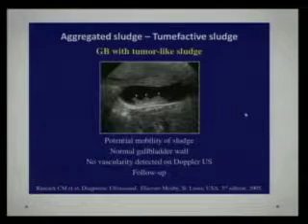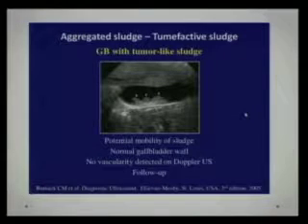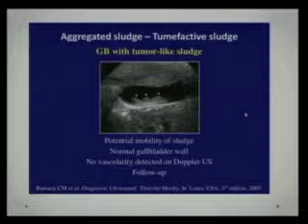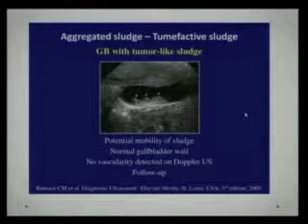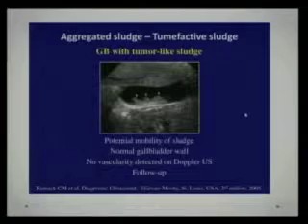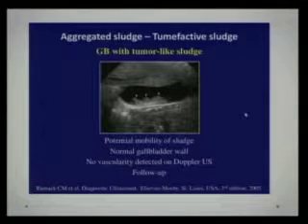However, I asked the technologist, please move this patient around, let him walk, turn him around everywhere. If this moves even a little bit, I'm convinced this is not a tumor. Also, if we call the patient back in 8 weeks and this has decreased in size, or rapidly increased in size for that matter, we know this is sludge, because no tumor will increase in size in a matter of 8 weeks.